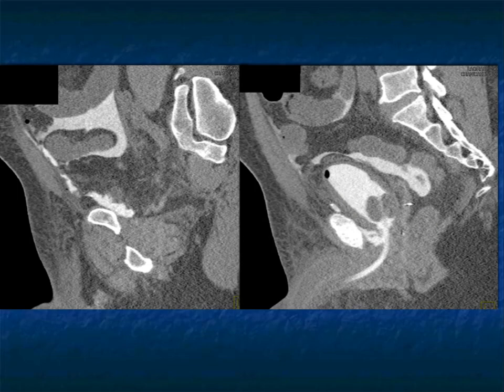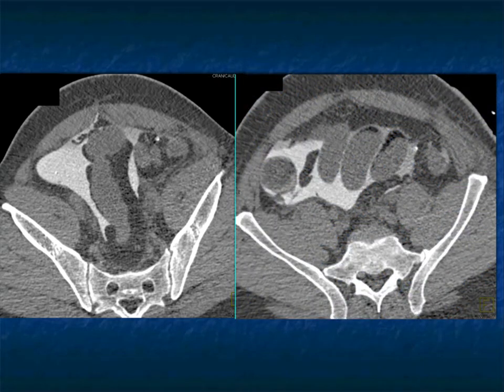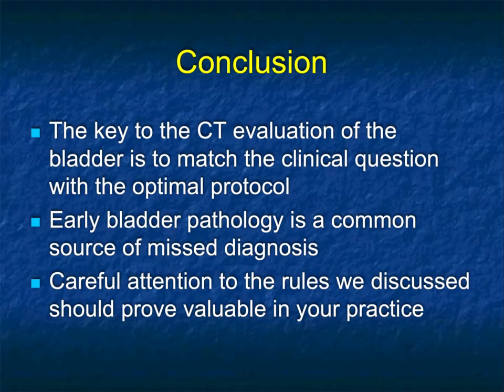When you have contrast extravasation from the bladder, it's intra or extraperitoneal. Once you start seeing the bowel loops in this case, here it is again, it's an intraperitoneal leak. And again, typically extraperitoneal leaks will solve themselves. Intraperitoneal leaks will often need surgical intervention. And just a beautiful example showing you those small bowel loops being around that positive contrast from the leak from the bladder.